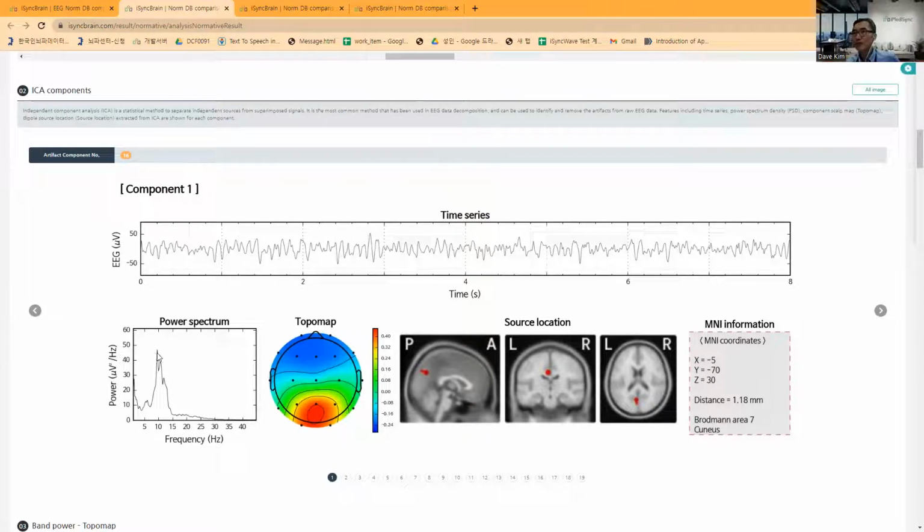Basically, the peak frequency is under 10 hertz, but alpha goes to more than 12 hertz. Her alpha frequency has a very wide distribution from low 10 hertz to mid 15 hertz. Very wide distribution, basically a kind of overarousal.